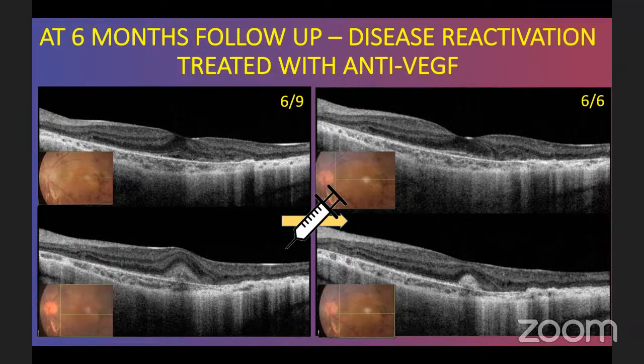Coming to Avinish's question, what are the biomarkers? One thing we can see is the autofluorescence. Usually the vitelliform lesion will show hyperautofluorescence, whereas the CNVM may show hypoautofluorescence.